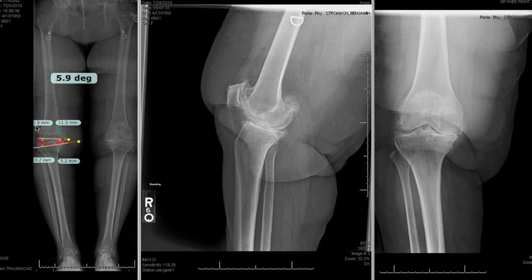I'm then going to look at my distal femoral resection levels. So these are fairly symmetric. We're at 10.9 and 11.5. You can use a true measured resection technique and measure each fragment, but I use this to relatively make sure that I'm going to make a symmetric femoral cut, and I'm not so absolute in measuring the numbers.